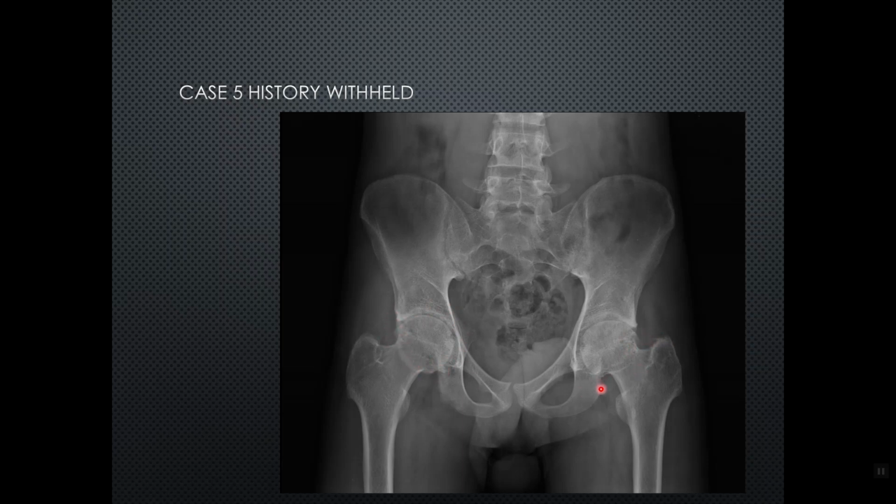But another important feature, look at this. That's formation of the marginal syndesmophyte. You can see how it's bridging end plate to end plate, and that's very characteristic of ankylosing spondylitis, not psoriatic, not reactive, but AS, or perhaps enteropathic arthritis. So we'll look at some of those cases.